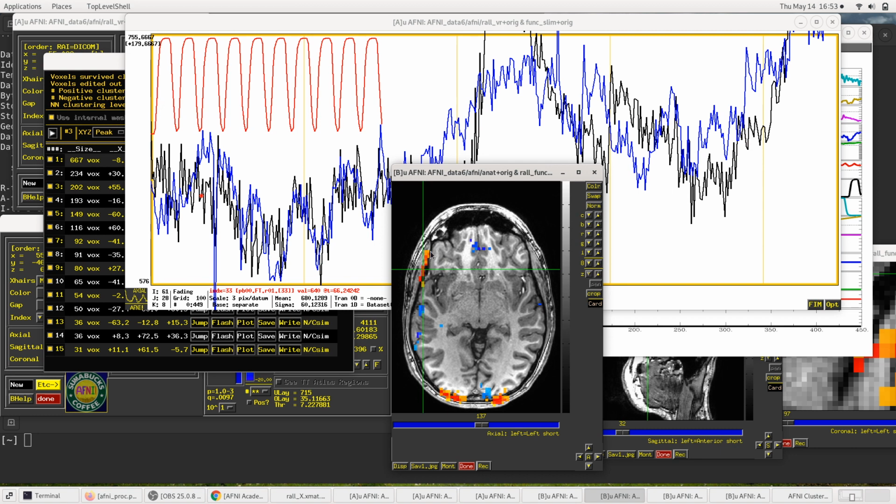Hopefully this would not match anything real going on. But if you don't mask the results, you can see, oh, this is something I may have to worry about. It may bleed into my results. I may have to explain it in the paper and say, this is just some muscular responses bleeding into the brain, but it's not an actual bold response.